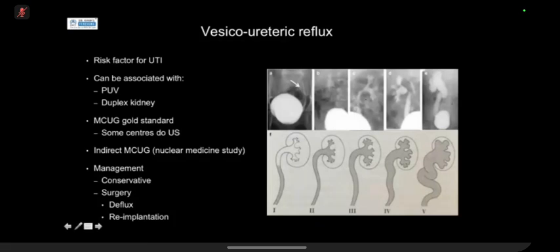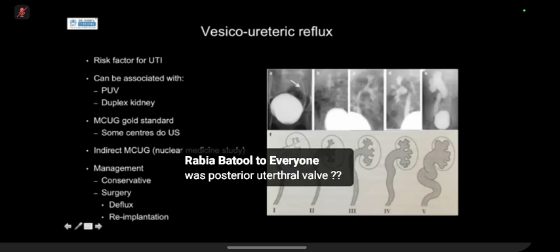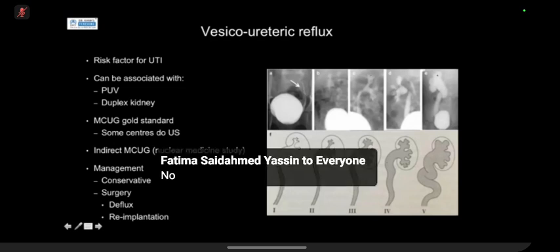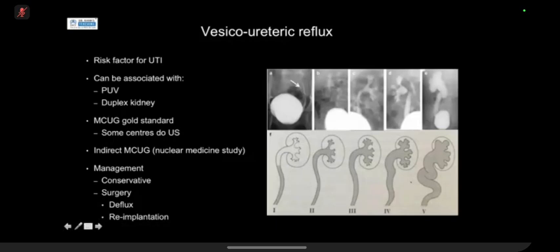So dilatation. So grade 3, you've got mild dilatation, but you can still see the papillary impressions at your calyces, and the calyces appear sharp and not blunted. Grade 4, you're getting blunting of your calyces, as you can see here, but you're still getting the papillary impressions between the calyces. And then grade 5 is where you get blunting of the calyces and you get loss of your papillary impressions, so it looks like a really dilated, baggy collecting system.